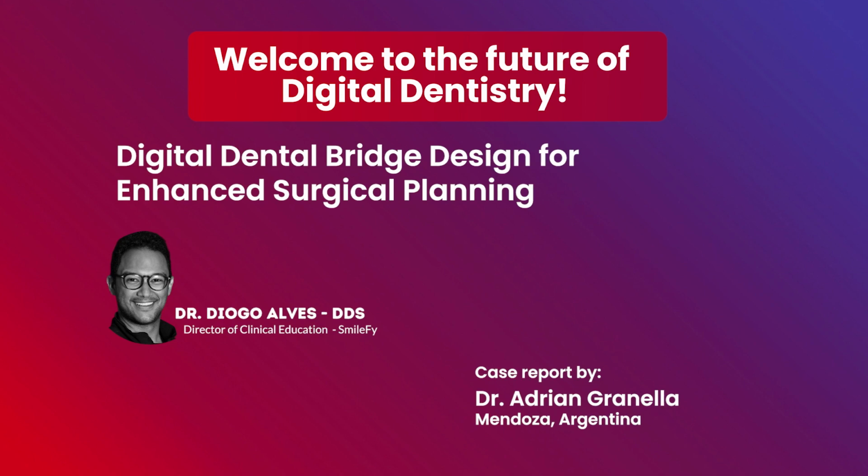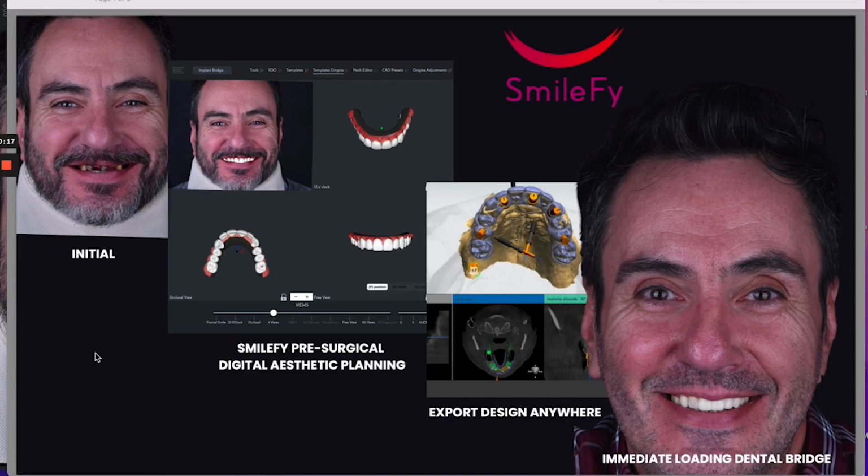about the importance of using pre-surgical aesthetic planning for your dental bridges. As we know, in extensive rehabilitation, such as the one that you are seeing on the screen, we must start with the prosthetic portion to then use that prosthesis to help us, to guide us on the implant position, and then perform the actual surgery and prosthetic part of the treatment.